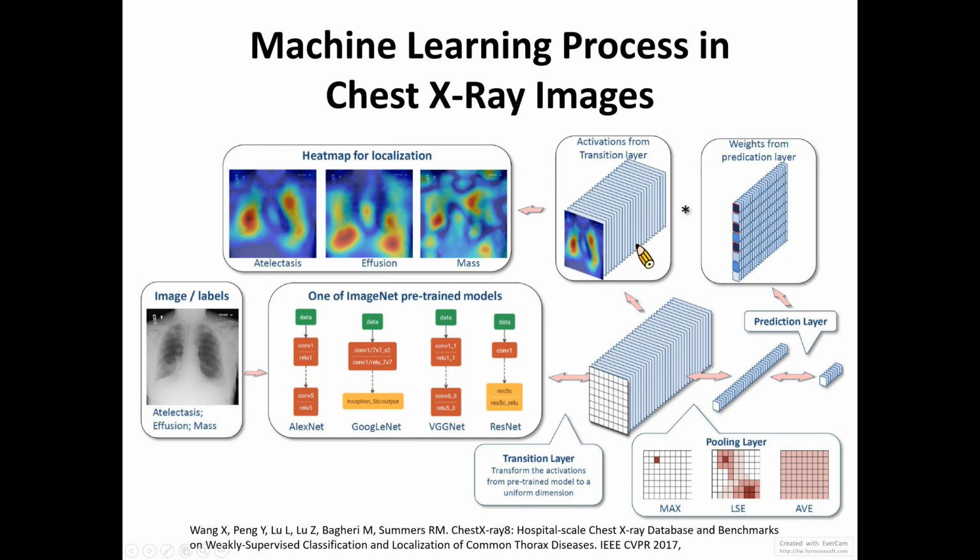So here I just open the MATLAB platform and show you the data set. I will provide a compressed file called pneumonia.zip. When you unzip this file, you will see a pneumonia folder, and if you dive into the folder, you will see there are two folders. One is 0 and the other is 1.